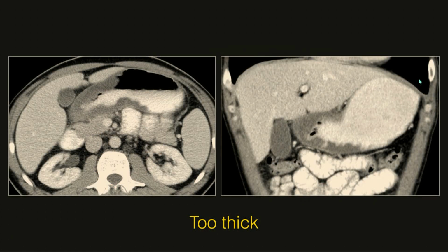And then we, of course, can encounter a stomach that looks too thick. If your first inclination is to think about cancer when you see this, that's not an uncommon one, but I want to give a couple of observations about this case that might make you think otherwise. So when you look at too thick of a stomach wall, think about the attenuation of the wall. Does it look more fluid? Is it intermediate, or is it high attenuation and enhancing?